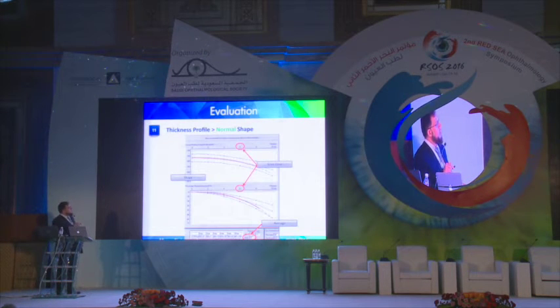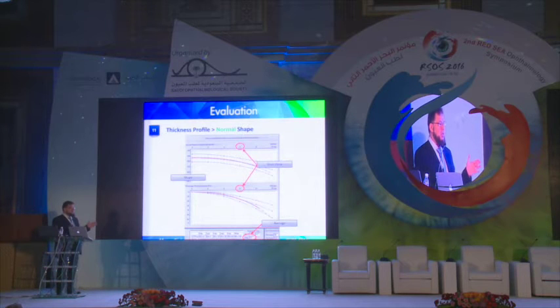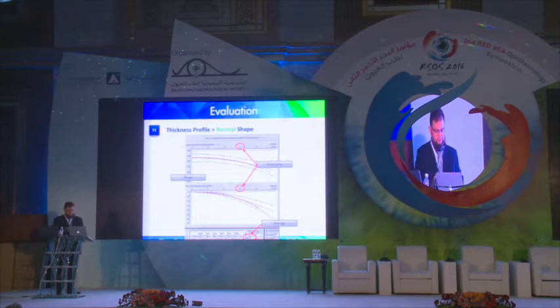We come to the spatial profile of the progression. I have to look at the shape and its relation with the 6 millimeter zone. Now, the normal shape takes its slope all along the passage without leaving its passage. And if it leaves its passage, it leaves it after the 6 millimeter. And the average should be always less than 1.2. It should be 1.1 and less.